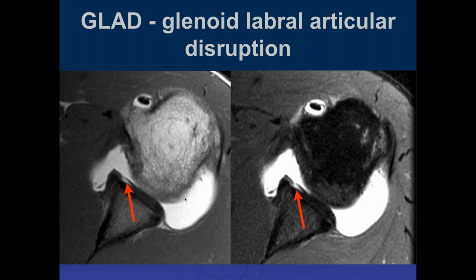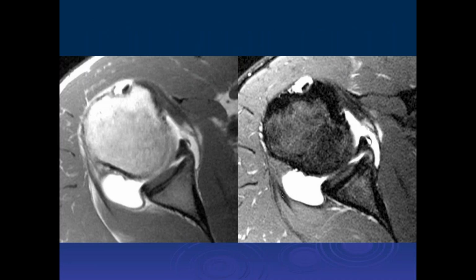Personally, I'm not enthusiastic about the term, but they're in the literature, and people like to pass them around as buzzwords. But in this case, I really like to describe the tear of the labrum, that you're undermining the labrum, give the measurements of it, and then the fact that the articular cartilage and the labrum is abnormal as well, which we can see better on other images.